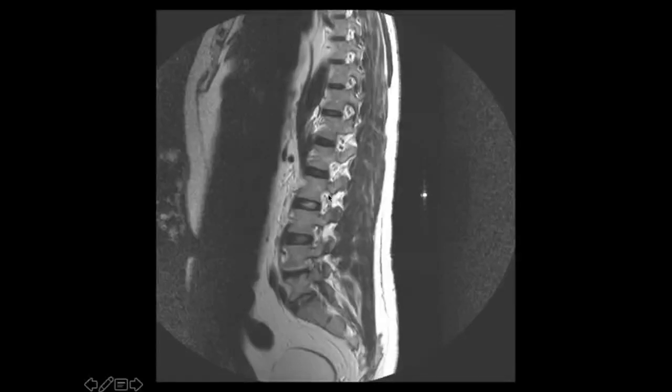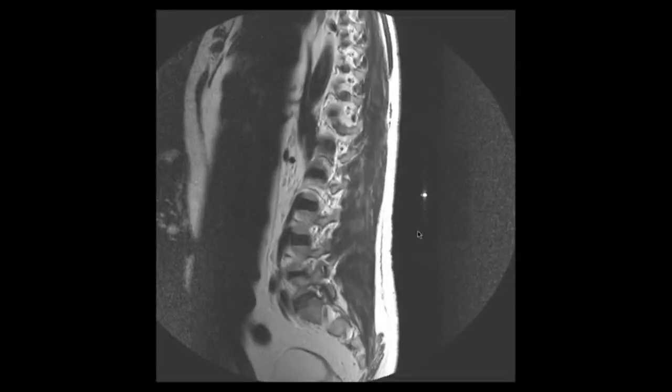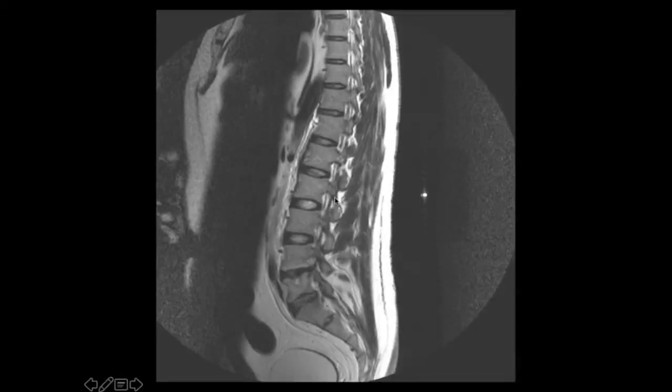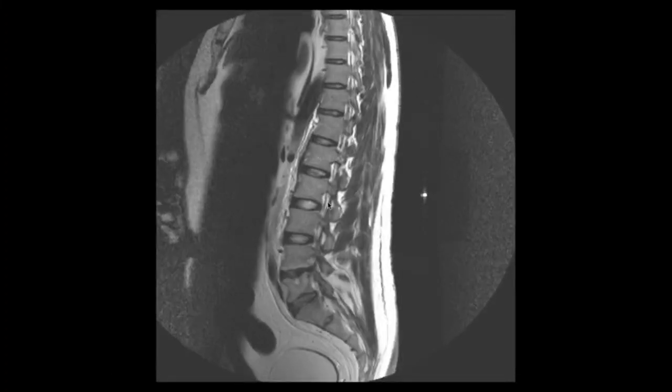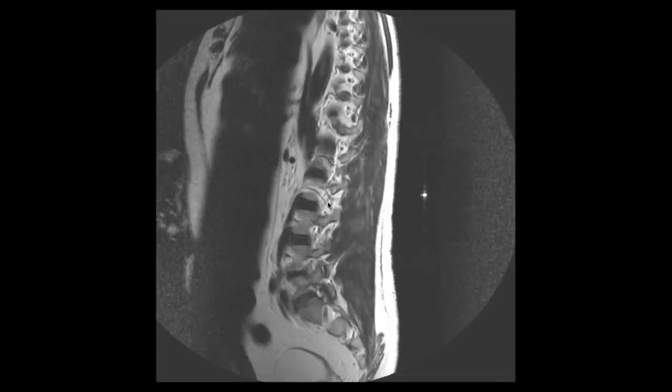You do see it exiting over here, so you can see part of it, you're just following it back and forth. This is where it's going into the neural foramina, and when it's exiting out, it just swirls around and goes out. If you're looking at it, this is more the parasagittal region. So that's the nerve which is exiting out. You can see quite a bit of the nerve exiting out, but you won't be able to see it on just one particular image.